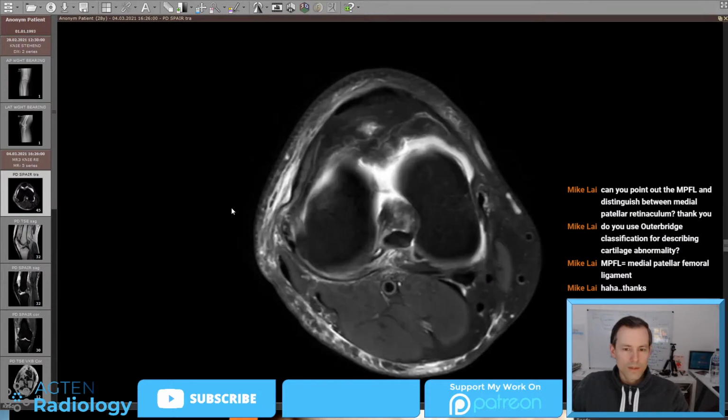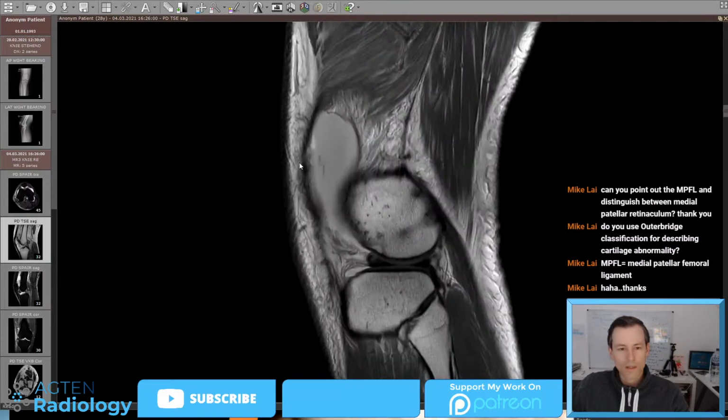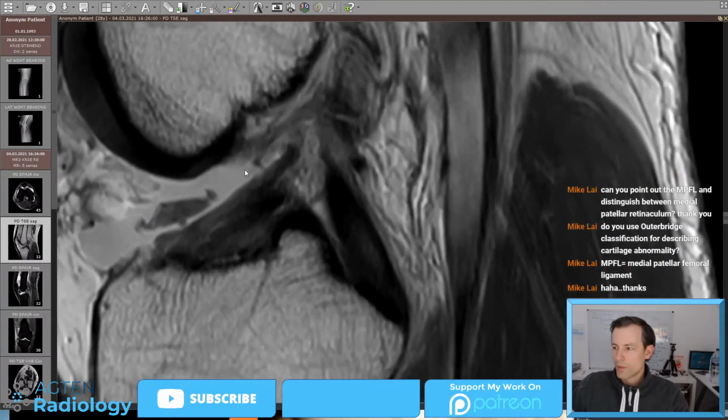Yes, now the other thing I wanted to show you in this case is this structure here. So just think about it. What could it be?